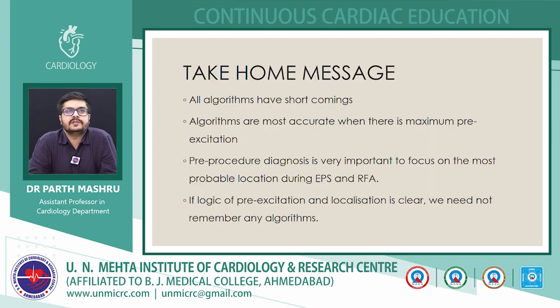So take home message, all algorithms have shortcomings. As we saw earlier, some of the algorithms are accurate for some particular type of pathways, others are accurate for other types of pathways. So the basic important thing is to understand the logic behind localization, and you will never go wrong with the localization of ECGs. Algorithms are most accurate when there is maximum pre-excitation. So if there is subtle pre-excitation, you cannot accurately diagnose where the pathway is.